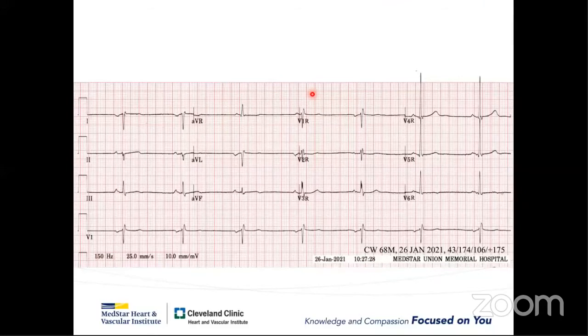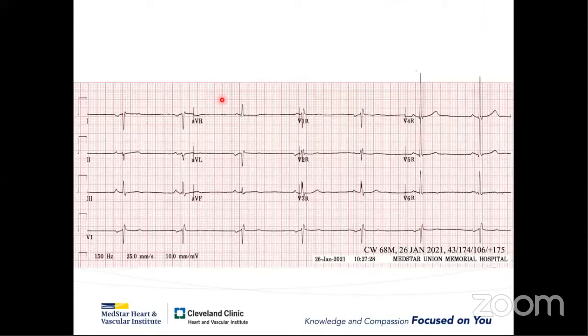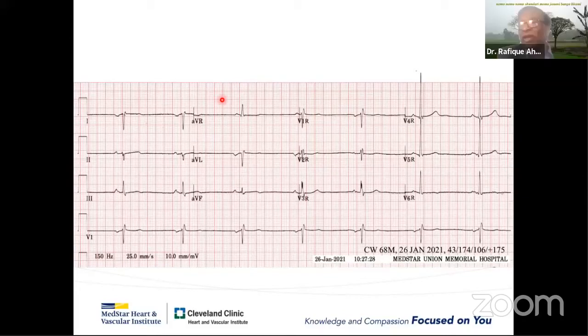Sir, if you give me this ECG without any clue, I give the impression that it is atrial inversus. That means the left atrium is on the right side, meaning the sinus node is in the opposite direction. So from the atrial standpoint it is inversus, if you give me only this ECG. Okay. So if you gave me this ECG without telling me that this is a right-sided chest lead, as an adult cardiologist, yes sir, we will just think of limb lead swap.